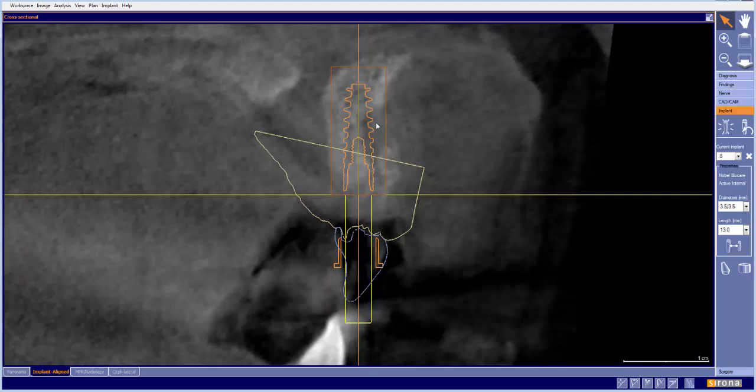And while we're talking about the buccal plate, I do have a question in regards to whether grafting was done, or how long after grafting this scan was taken, because there seems to be a little bit of a discrepancy right here. Maybe that's an area that hasn't fully radiographically filled in, but nonetheless it's an area that will require some potential attention during placement and surgery.